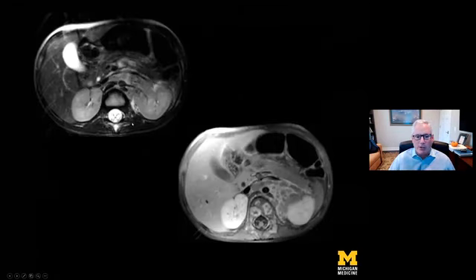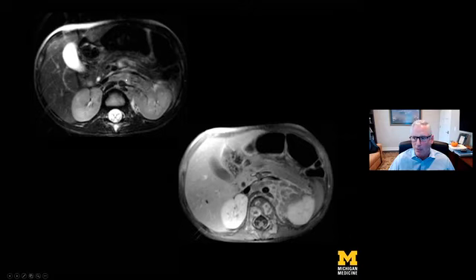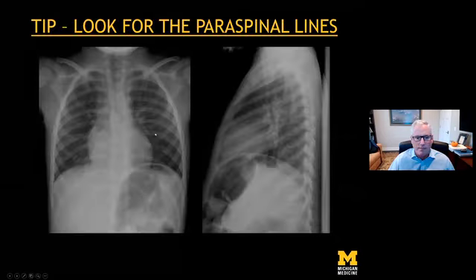And in the same patient, we can see this suprarenal mass effect on the kidney. And I want to point out how it is encasing, as we talked about with the IDRFs, the left renal artery. There is mass effect on other structures. And again, you get a beautiful look at the spinal canal.